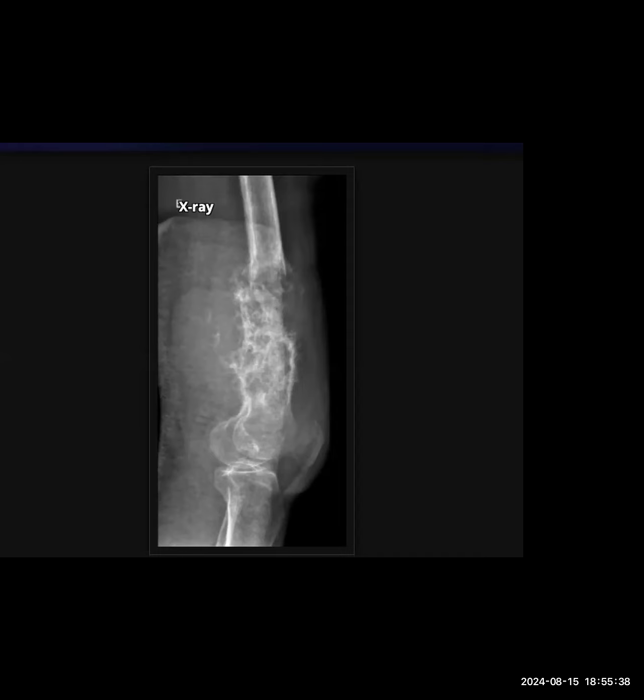There is complete erosion of the bony cortex, and there is a ring and arc type of calcification or matrix mineralization within this lesion. Also, this lesion has a wide zone of transition, though it is not extending into the joint cavity, up till the articular margins. There's no bony sclerosis around it. There is an irregular periosteal reaction as well. The rest of the bones appear normal.